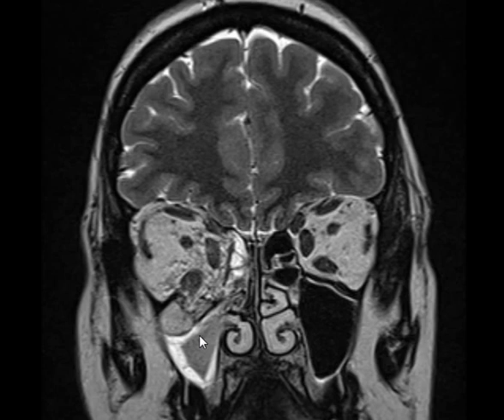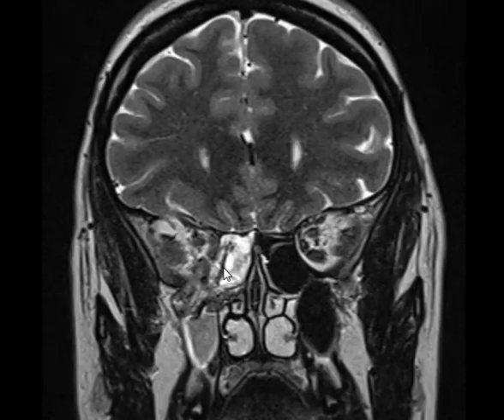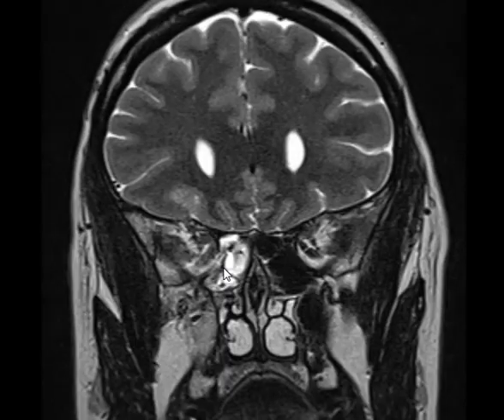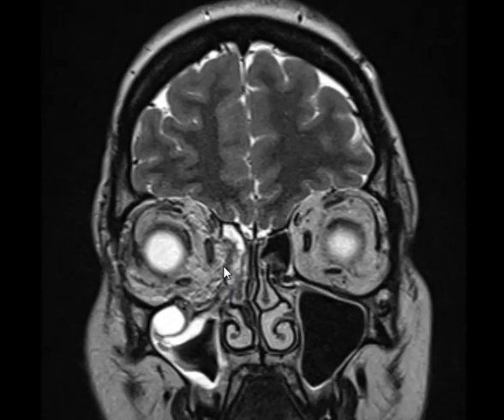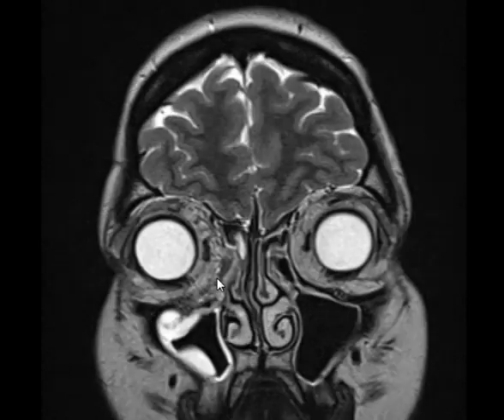So what's hyperintense on T1 and hypointense on T2? Fat, blood. Blood. Yes, good. Hematoma. So this is hemosinus. What else? There is also a high abnormal signal on the medial side of the orbit. Good. What else? With hypertrophy of the muscles. Hypertrophy of the muscles, okay.